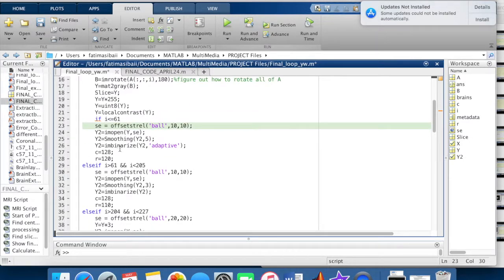Additionally, smoothing is a function that basically applies an averaging filter of window size 5 or 3 or any odd number, and we mostly used a window size of 5 and 3.